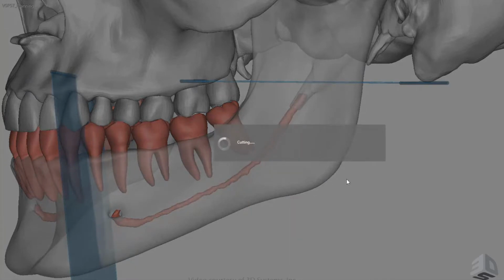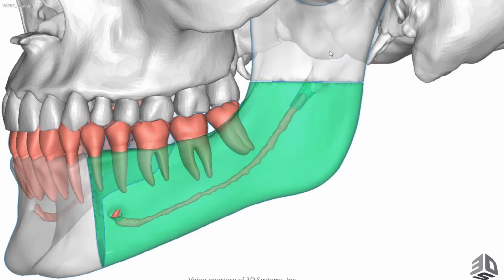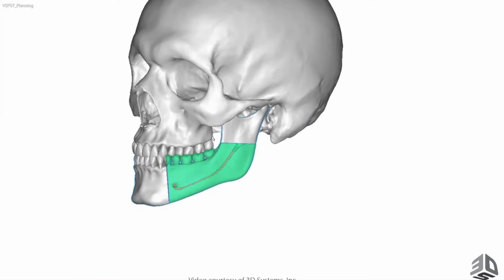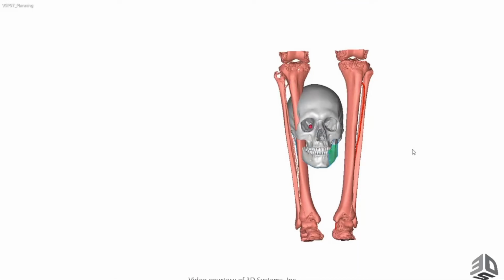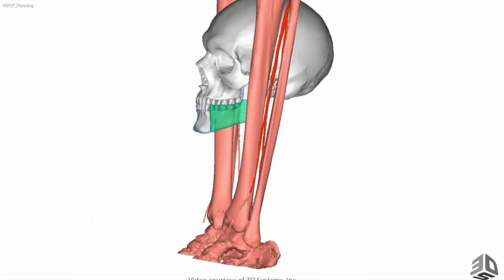Absolutely. So we'll go ahead and simulate those osteotomies here. And then, as I understand it, we're using the left fibula for reconstruction today. Is that correct? Yep, that's right. So again, for the purposes of the delegates on the course, the side to use is influenced by many factors, including not only where the pedicle is going to come out, anterior or posterior, contralateral neck is used in vessel-depleted necks, for example, but also you want to think about the three-dimensional relationship of the soft tissue and also subtle factors like how mesial into the floor of the mouth the resection will be.